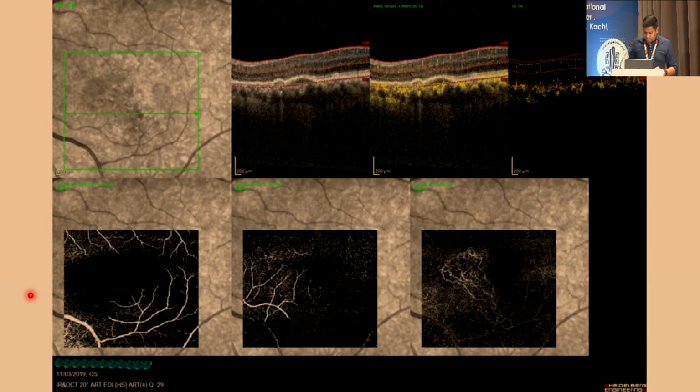Like you see here in this image, if you see this area, the network is not actually seen very nicely, and if you do a manual segmentation, layer by layer, you will find that there was an even bigger network than what we see on the image here.